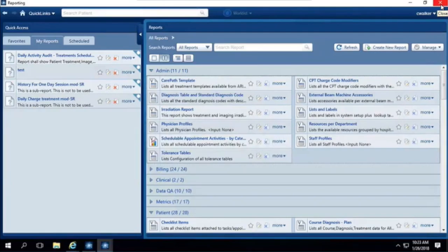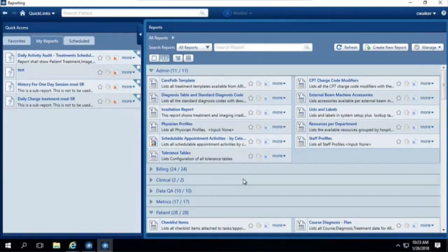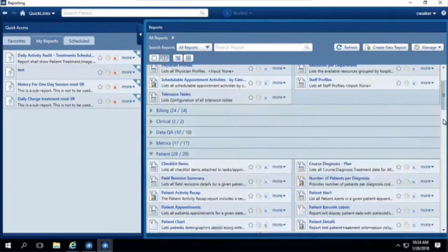Let's say that that's the case where I'm using a report currently in the clinic, and I notice it's got almost everything I want, but it's maybe missing just one piece of information, or maybe it has too much information and I want to slim it down some. That would be the case where you just edit it in Report Builder and then remove some of the pieces or add in the pieces that you want. Okay? Now there's also the chance, and let me jump back into this one real quick, there's also the chance that you might have a report that you like, but it truly just doesn't have everything you want. Okay?